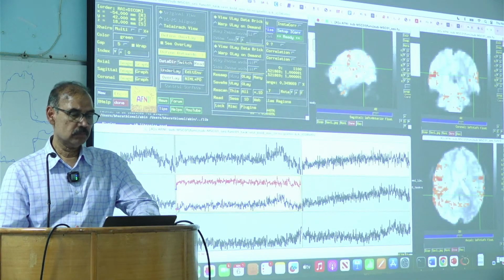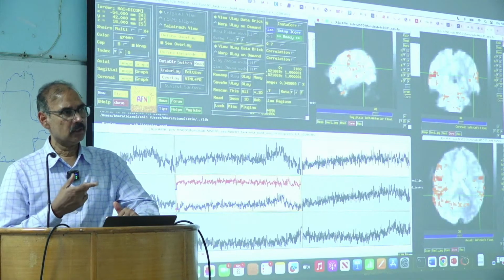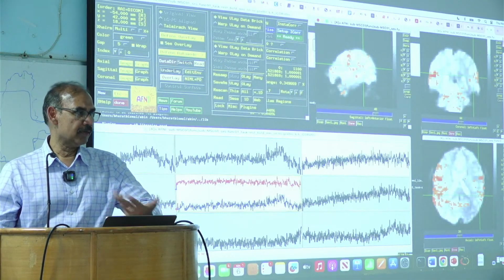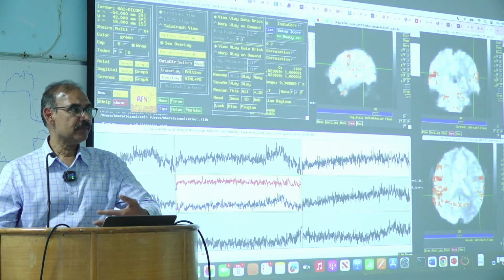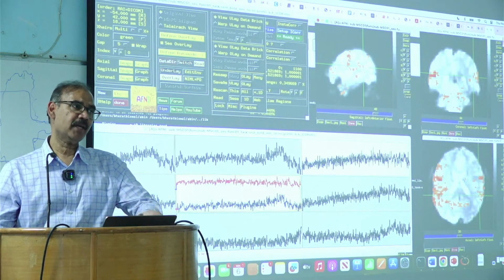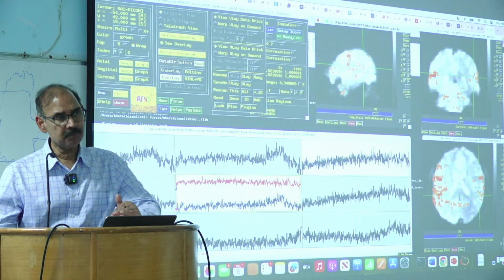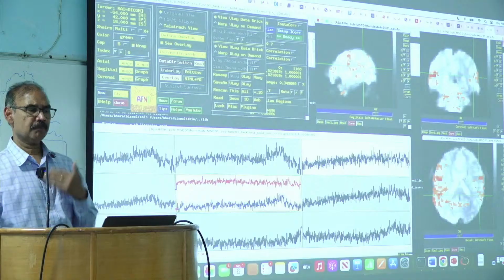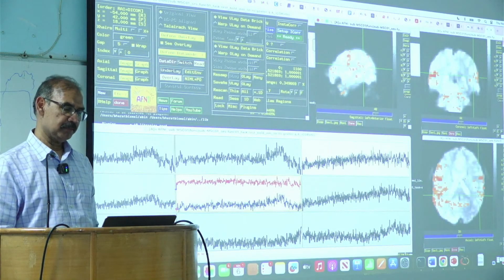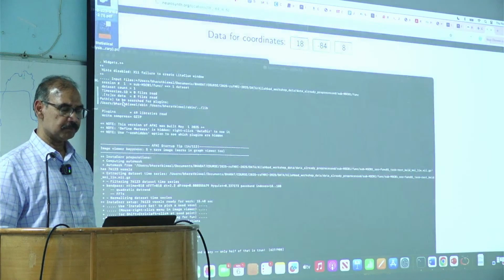So should we cover some lecture, or have all of you been able to generate the maps? Okay, so maybe let's try to do the second subject. Run the second subject, keep the original coordinates, and let's see whether we can replicate the results. Okay. So I'm just going to close AFNI.